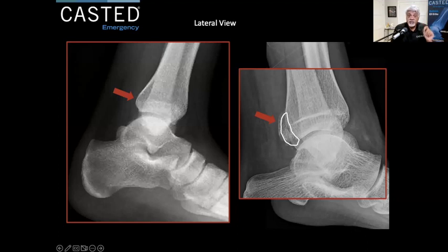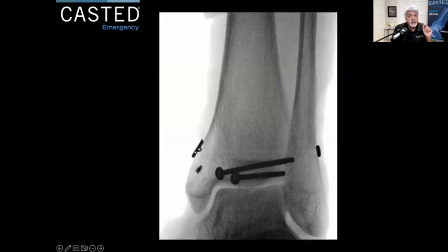If you see a posterior mal fracture, most of the time, it's with a lateral mal or a medial mal fracture. That's a bi or a trimalleolar fracture. Sometimes it's in isolation, and sometimes it's actually higher up with a fibular fracture. We'll dig into those during the course itself. But for this case, if ever you see a posterior mal fracture, it is more worrisome. In this case, it was an operative case. We'll go through these types of cases during the course.